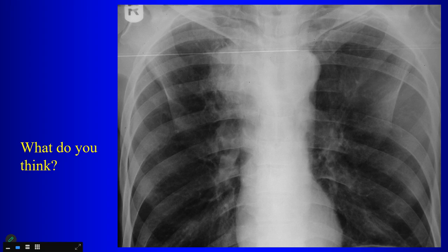Is there another finding on the chest radiograph? Is the mass moving into the trachea? Where's the trachea? Okay. Yeah, it looks like the trachea is in here somewhere, but.